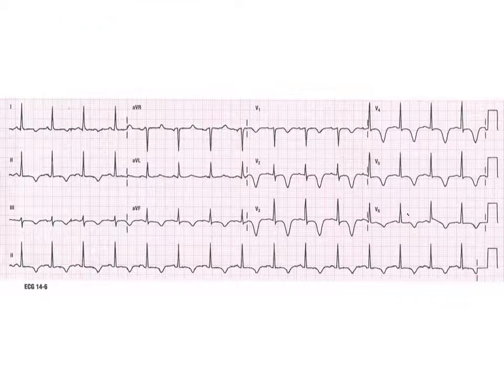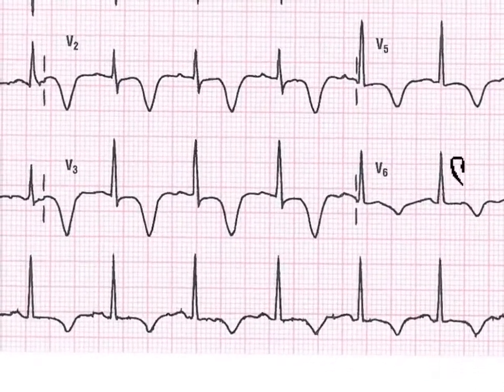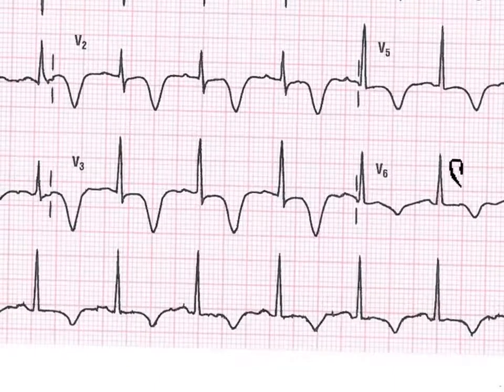This one looks fun, and I'm going through these pretty fast. I haven't even seen these, so bear with me here, and if I make a mistake, I need someone to point it out. So that's part of your learning on this, is to double check my interpretation. That helps you kind of double check things.